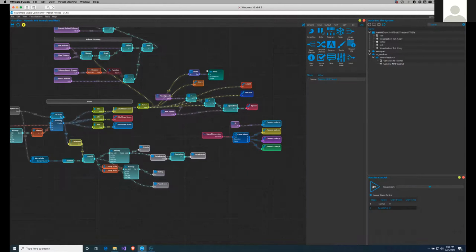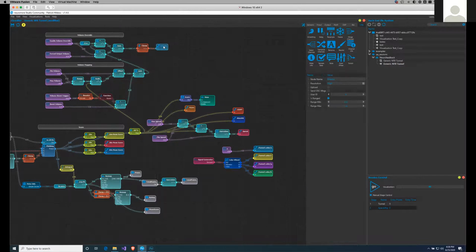Then we have a bunch of outputs here. We have a volume node out here. That particular volume node is pretty interesting, because if you call the volume node just Volume, like it's spelled here, starting with a capital and then lowercase, then the studio automatically uses that particular node to control the output of an experience of the studio in real time.